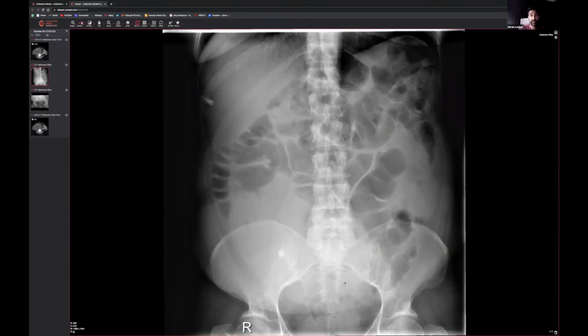This patient is a female patient, which I probably should have mentioned. So this could be a uterine lesion, or it could be an adnexal lesion, i.e. ovaries. And obviously, being in the right iliac fossa, it could also be something like an appendix. It's quite unusual for an appendix to be this big, but if you do have an appendiceal tumor, that kind of thing, then yes, you could be looking at an appendiceal lesion.